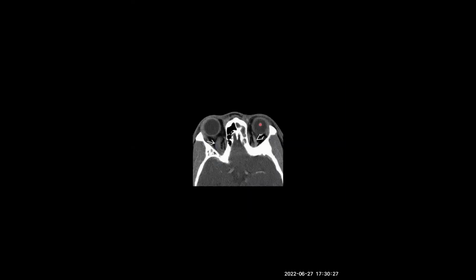and check the structure. Here, normal enhanced superior ophthalmic vein, and here ophthalmic vein enlarged, distended, and there is a filling defect. So it is thrombosis. It is very near to the cavernous sinus, very near to the cavernous sinus. So you have to assess and give a clear comment on the cavernous sinus when you find a thrombus in the ophthalmic vein. Okay.